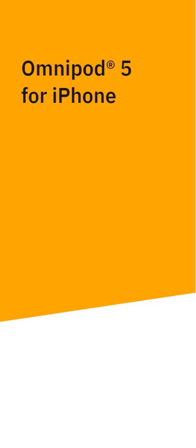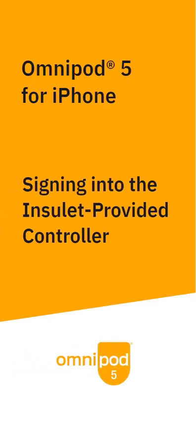We're almost ready to set up the Omnipod 5 app on your iPhone. Before you can use the Omnipod 5 iPhone app, you'll need to sign into the Insulet-provided Controller to confirm that your healthcare provider has prescribed the use of the Omnipod 5 system.